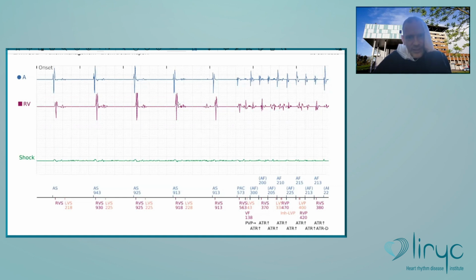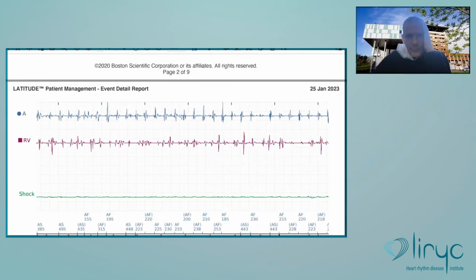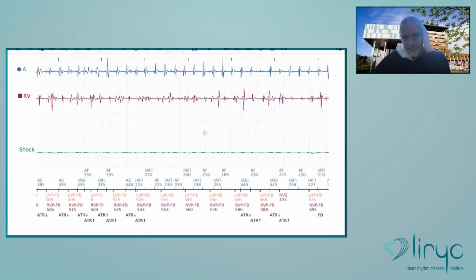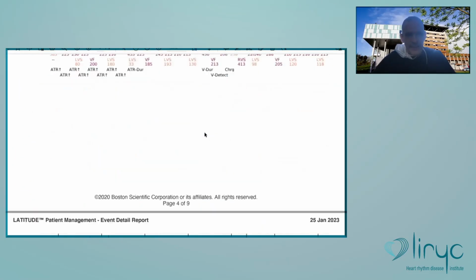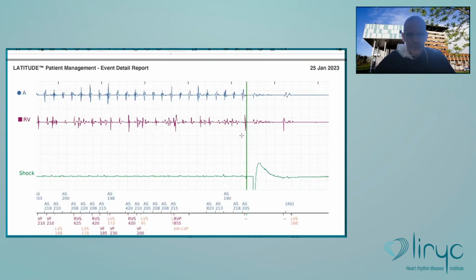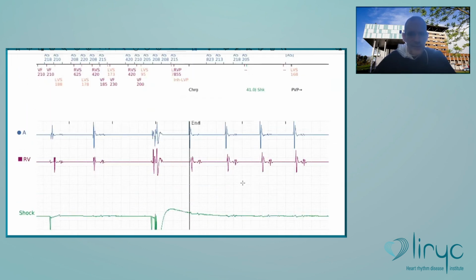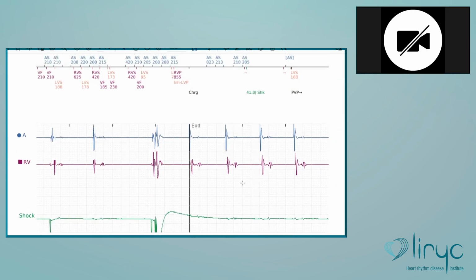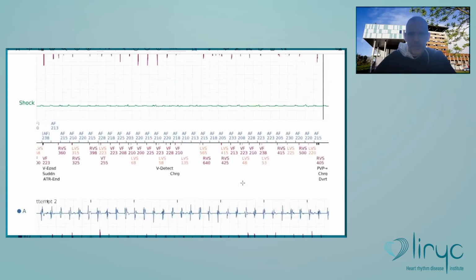And if you look carefully here, you see that the timing is very close, right atrium and right ventricle. At one time it's prolonged, and you see it's exactly at the same timing, and then one shock is delivered because this is the end of the charge. And then what do you see? Well, it terminates both arrhythmias. So what could be the possibility here?